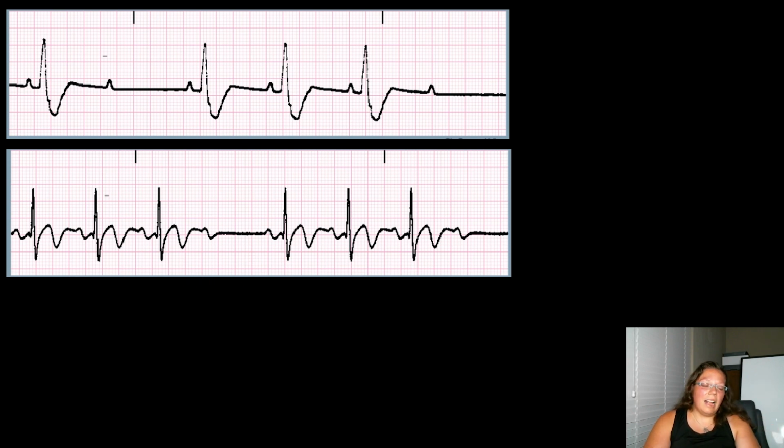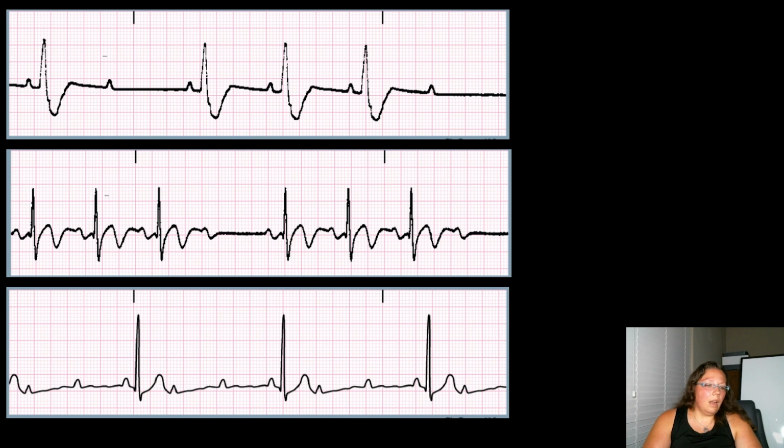I think I like type 1 more because it's more interesting. There's more going on. You know, your PR interval's getting longer and then it drops. This is boring. You know, your PR intervals are the same. I think that's why I like Mobitz 1 more. All right.